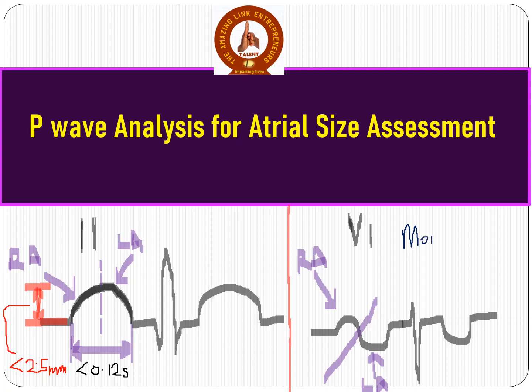Morris index is a product of the duration and the depth of the negative deflection of the P wave in V1.